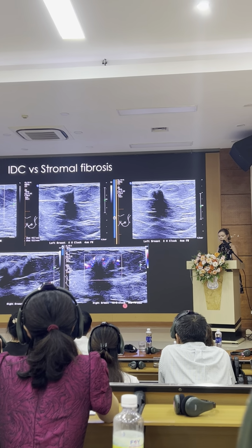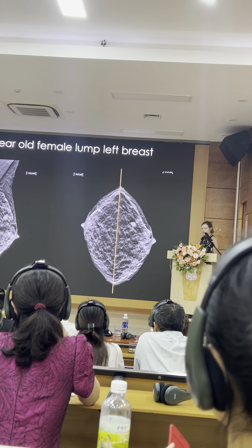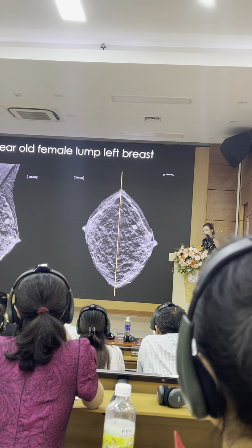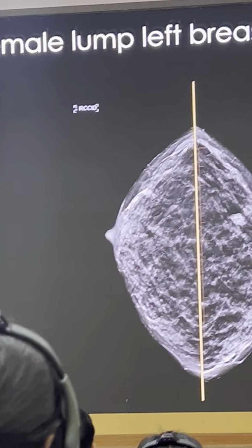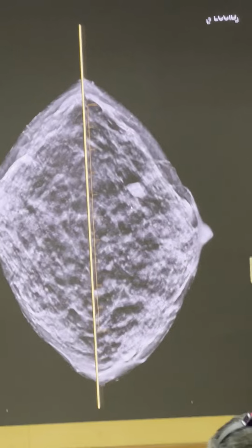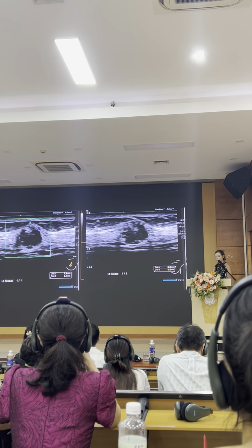And this is the next proliferative breast condition. This is a 40-year-old female with a palpable lump in her left breast. Pretty sure you can all see that. There's a small mass with slightly irregular margins in the upper outer quadrant of the left breast. And this is what it looked like on ultrasound. It's a hypoechoic lesion with some irregular margins. It's nearly taller than wide, extending through the tissue layers. It has at least indeterminate, if not suspicious, findings on both ultrasound and mammogram, and needed biopsy.